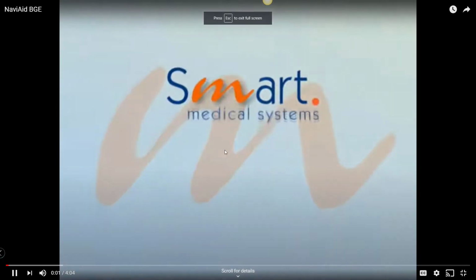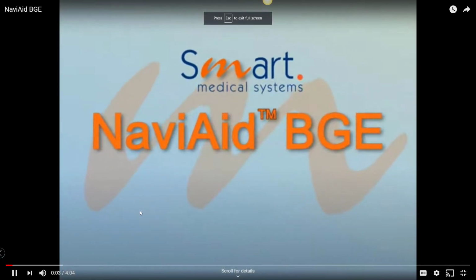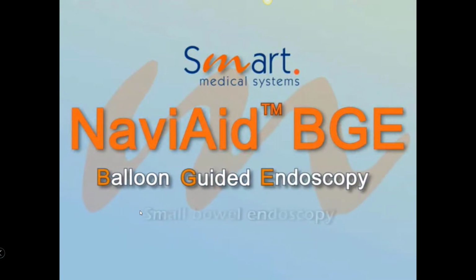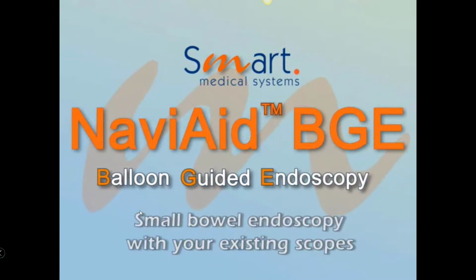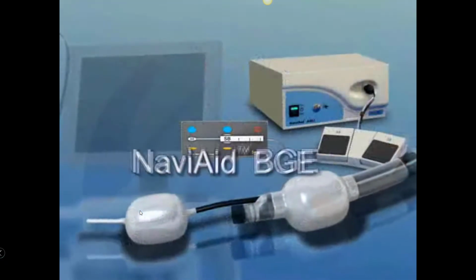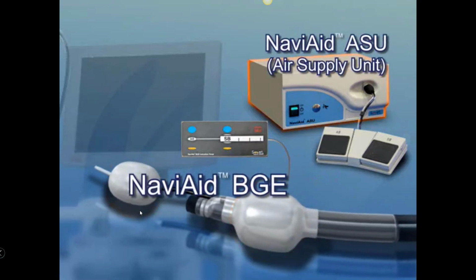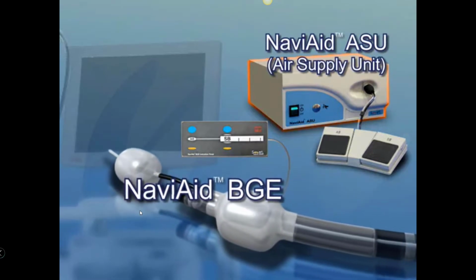Smart Medical Systems presents the NaviAid BGE, a balloon-guided endoscopy device enabling small bowel endoscopy with your existing scopes. The NaviAid BGE device comprises an add-on disposable two-balloon element and an air supply unit.